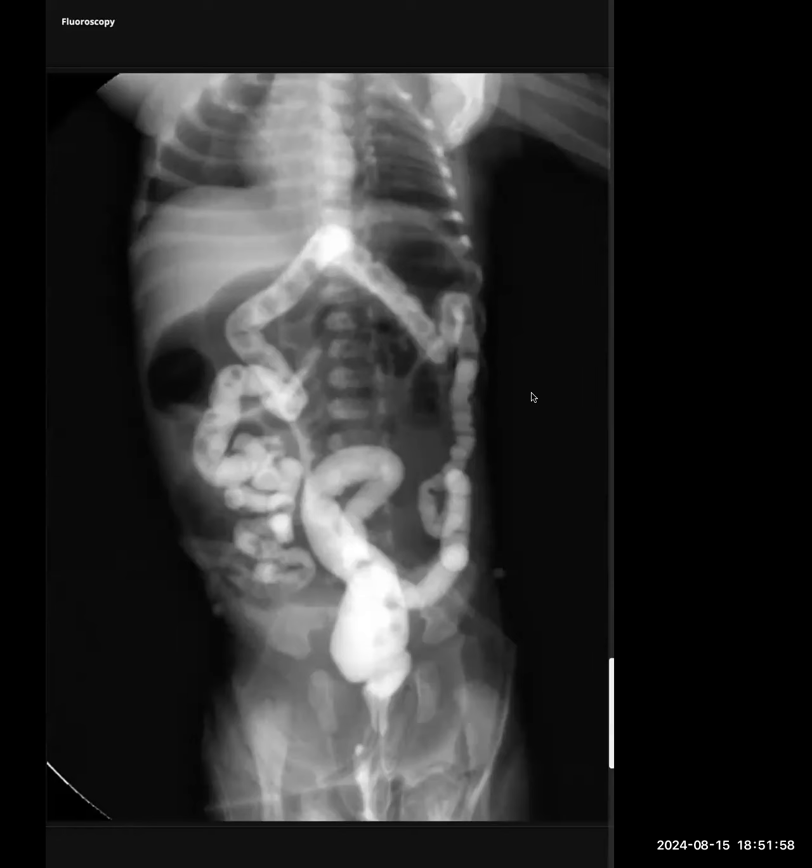This could be distended bowel loops. I do not see any air fluid level, but it appears to be a pneumoperitoneum. The whole of the abdomen is filled with these gas shadows. What sign of pneumoperitoneum do you see here? The football sign, maybe. The whole thing is dilated and filled with air.